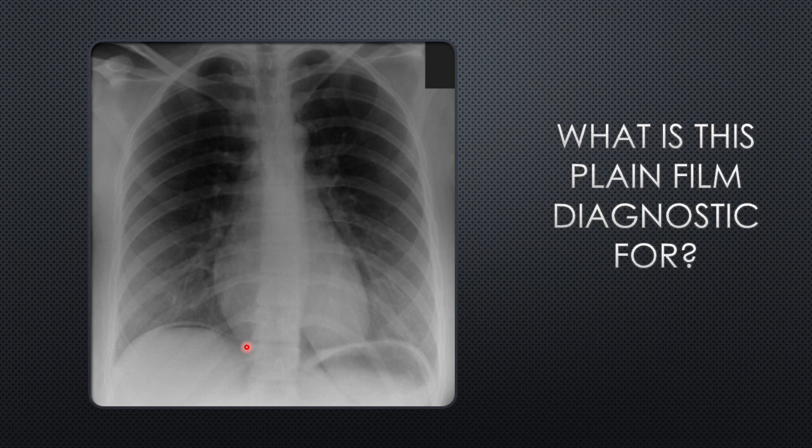This may well also be secondary to insufflation from laparoscopic surgeries, and thankfully this was the case here. But in any case, this is a worrying sign, and it's indicative of a bowel pathology, usually perforation.